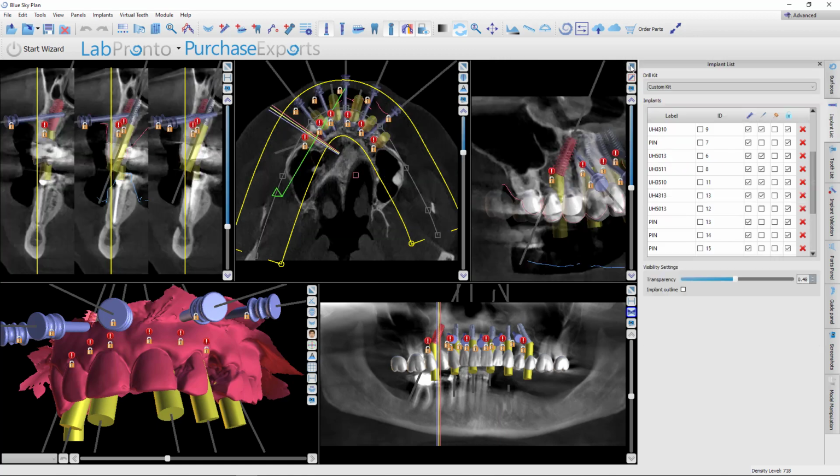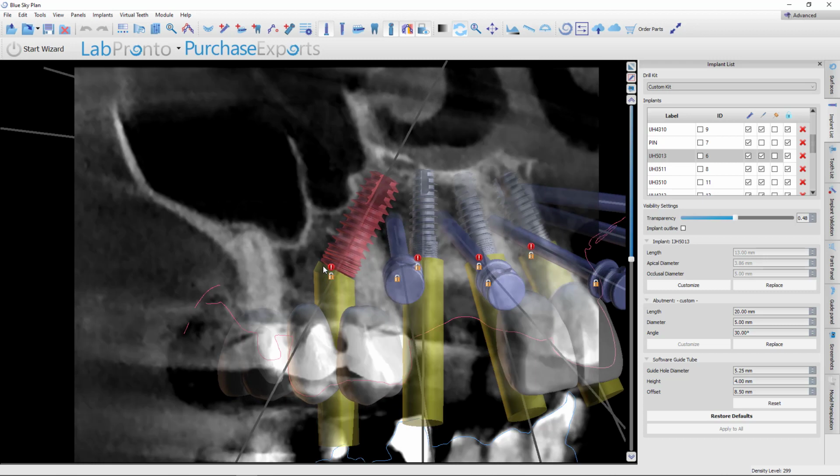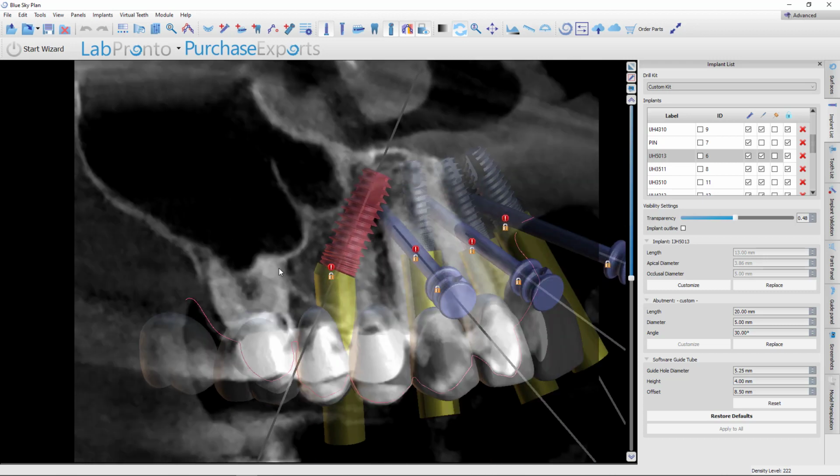This one is a disto-angulated implant. You can see we're hugging that sinus right here. There's really not a lot to work with beyond that. And so, perhaps you could do a sinus lift here and put one vertical, but you've got this big fin up here in the sinus, the septum. And so really the best scenario for this particular patient was to go disto-angulated.